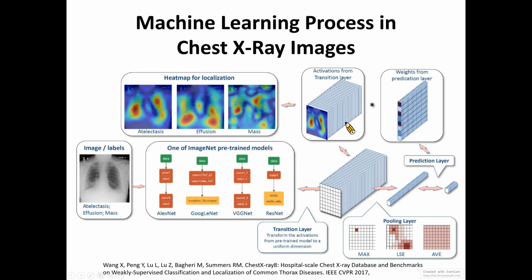For example, if you train this pre-trained model to see atelectasis, then you will try to visualize the results from these layers.